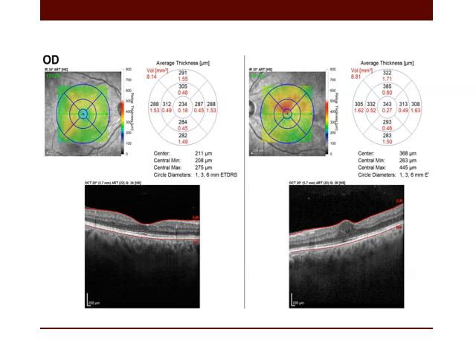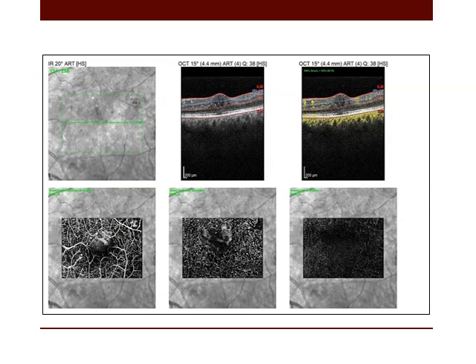Again, a patient with a nearly dry right macula and cystic changes involving the central macula in the left eye. On performing OCT angiography, a special finding was detected. At the site of the cyst, there is a white, not black appearance. Why? Some interpreted that by the presence of motion within the cyst, and since the instrument is designed to detect motion, it will project it as a white appearance and not a black one.